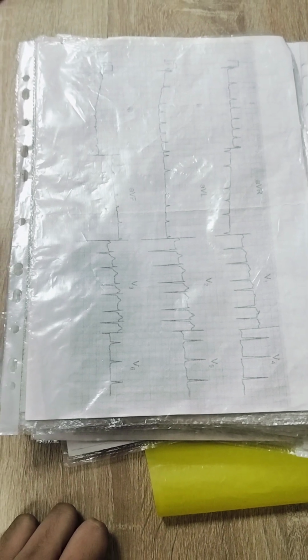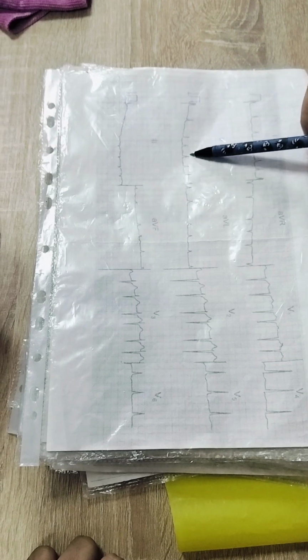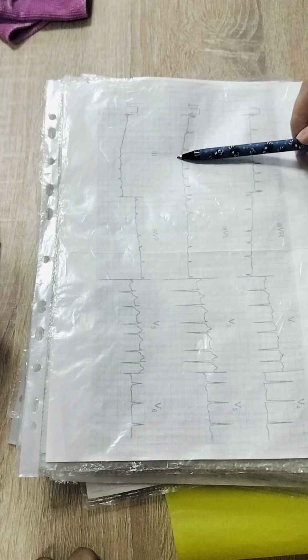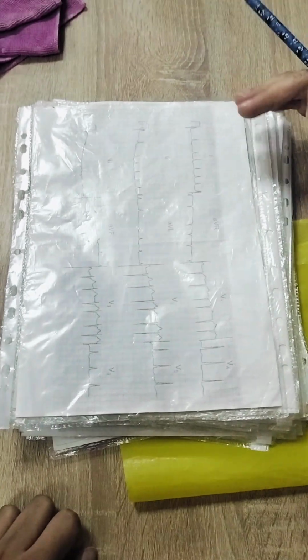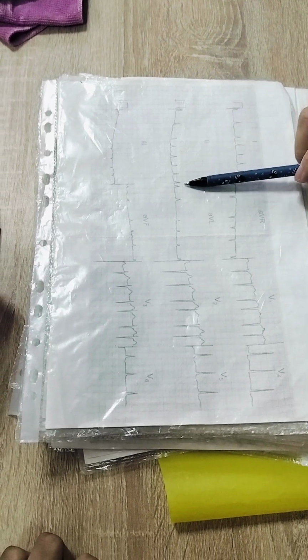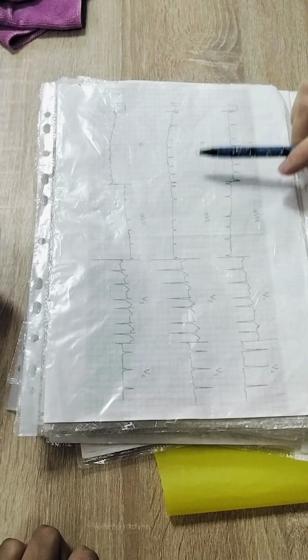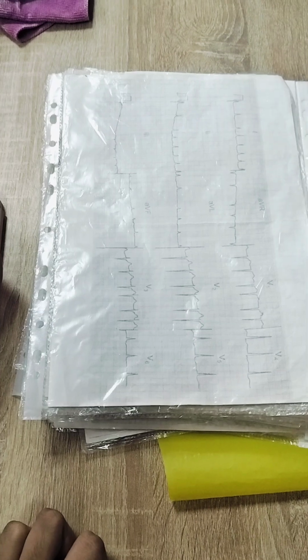Next step, heart rate. So we need to take these distances, count average number, 60 over this number, and speed of tape. If it is not written, it is 25 millimeters per second. In other cases, it will be written. Using formula, we will count heart rate, and we will find that there is tachycardia. I don't know how many beats, so we need to count it. If somebody is interested in it, let's do it.